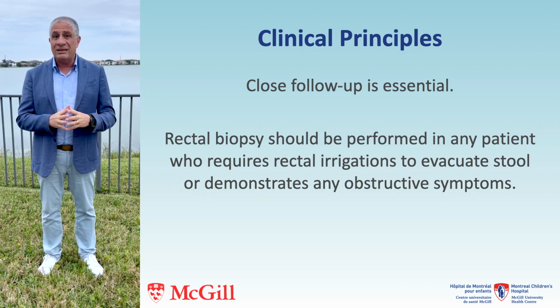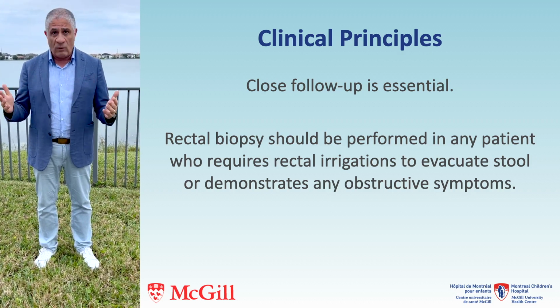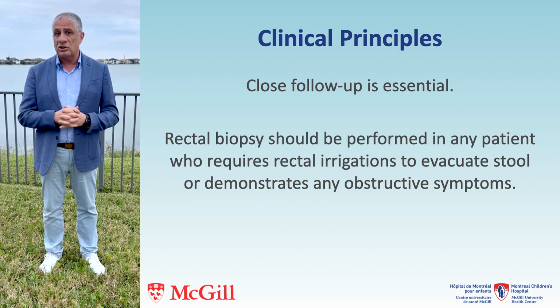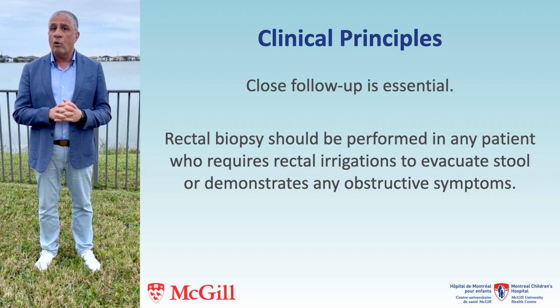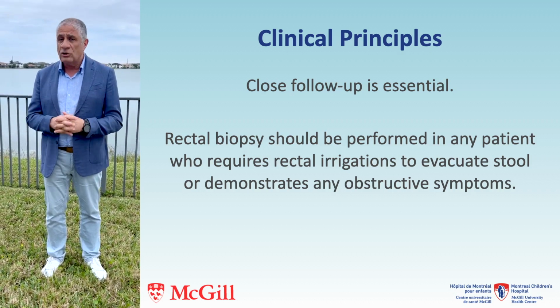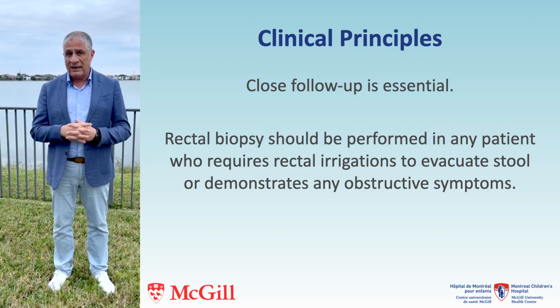This baby did not need anything else other than the contrast enema, and in fact fed and evacuated meconium very well, and was simply observed and diagnosed as a small left colon with no need for a rectal biopsy. The baby still has to be followed to make sure it does not develop unusual constipation in the future, and in fact this was the case.